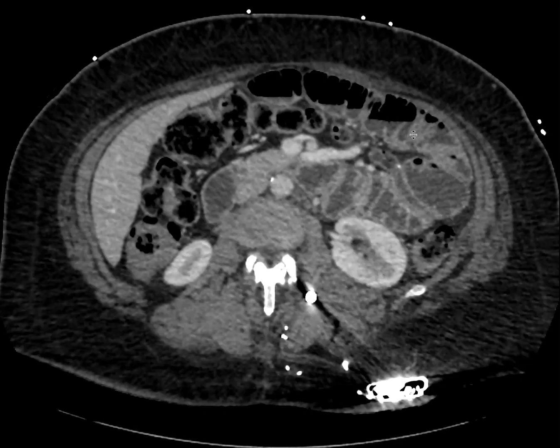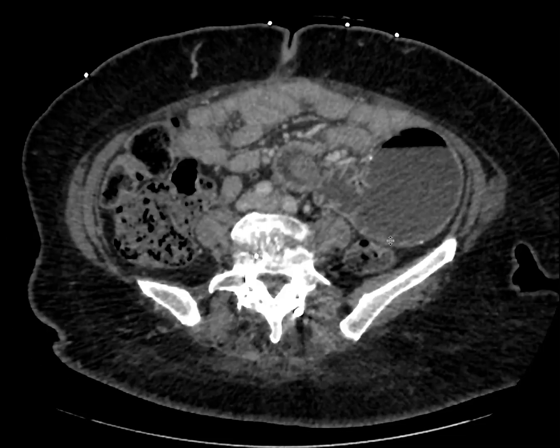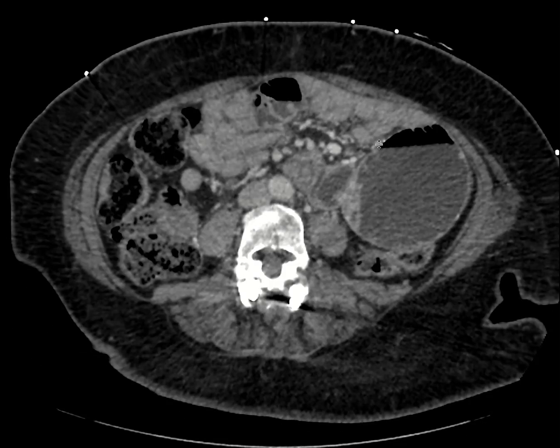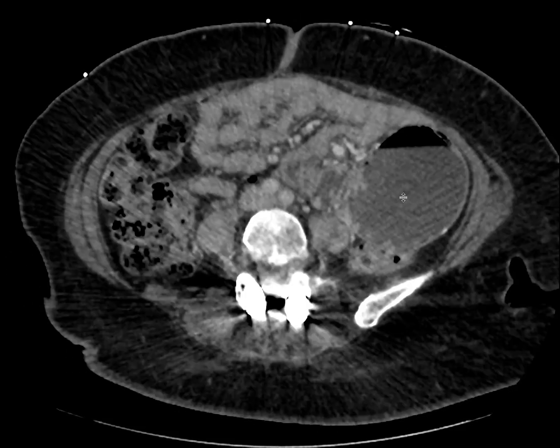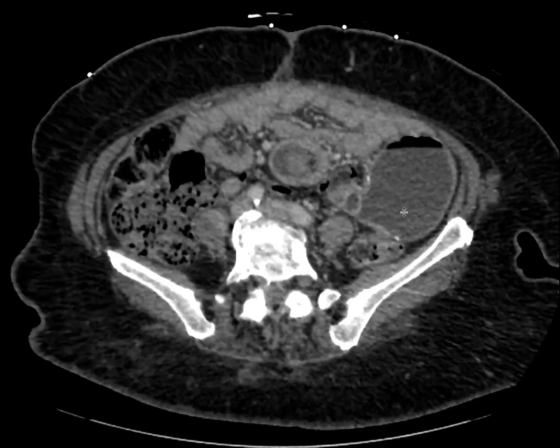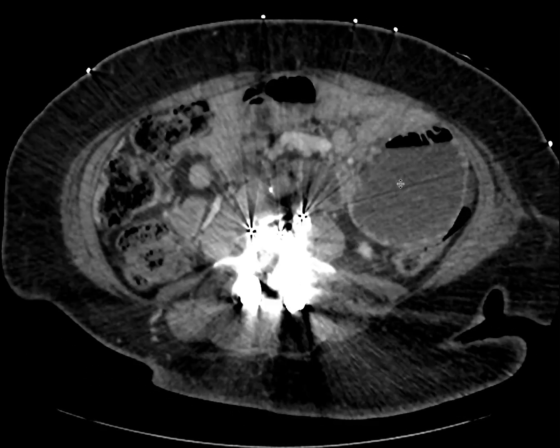It can be a little difficult. It does look like the bowel loops are a little dilated, but again, it can be difficult given that this patient has denervation of this loop of bowel, and it can appear floppy. But these retrograde intussusceptions need to be evaluated surgically.